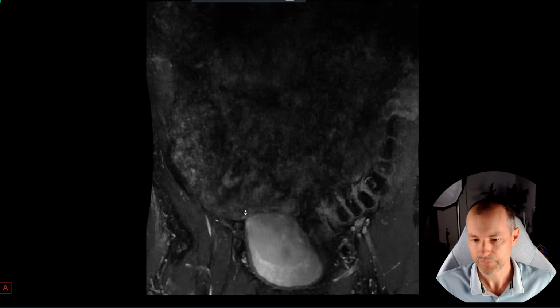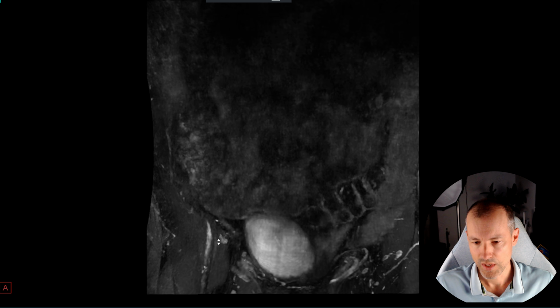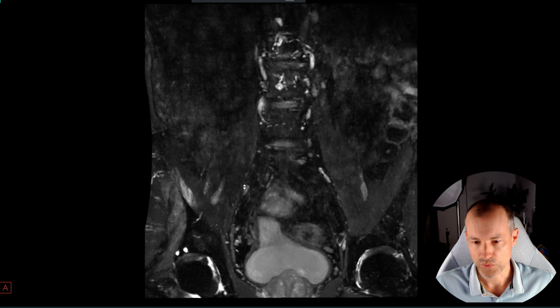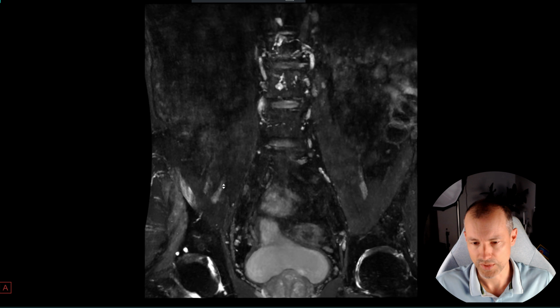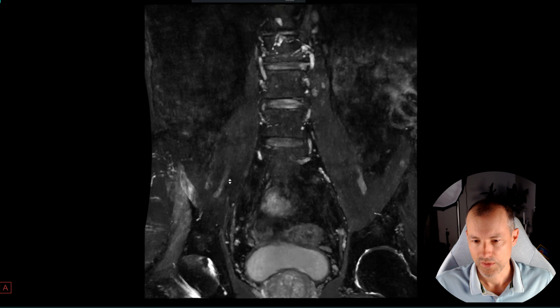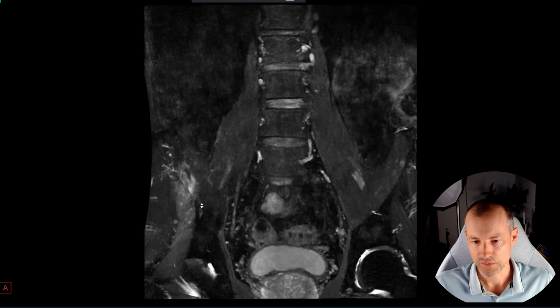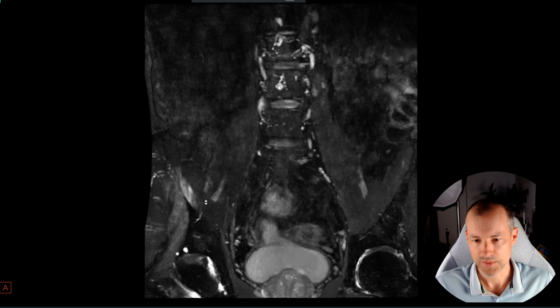So we have a neuropathy, but also you can see there are multiple splits, or slips rather. The femoral nerve can sometimes have different variants in terms of the number of nerves, the level of splitting or distribution into different areas. But I think the interesting bit in this case is there's more than this. But why is this? Like, what's this one here? If you look here, there's an additional fiber, potentially a nerve. I'm not sure if this has been disrupted here as part of this.